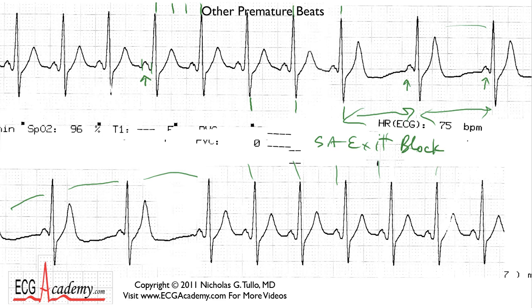And again, the key is in the T waves. Look at these T waves. They look very smooth and very consistent, and then suddenly this is Mount Fuji over here. And why is it Mount Fuji? And why is it followed by slowing of the ventricular rate? Well, that's because right here is a P wave that did not get down the AV node.